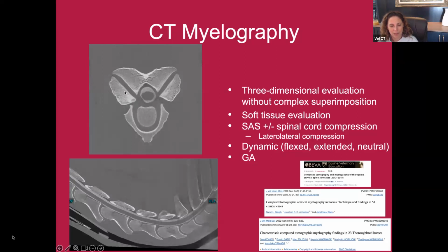There's a fair amount of subchondral bone sclerosis in this right-sided articular process joint. There's periarticular modeling or enlargement there and there. We can actually see some of that on the other side, a little periarticular proliferation. I didn't include the soft tissue window, I don't think, but you could see synovial proliferation from this joint as well, if I showed it to you in a soft tissue window.